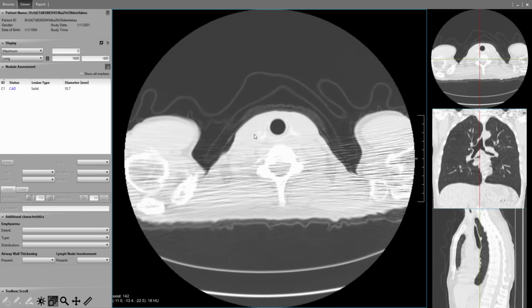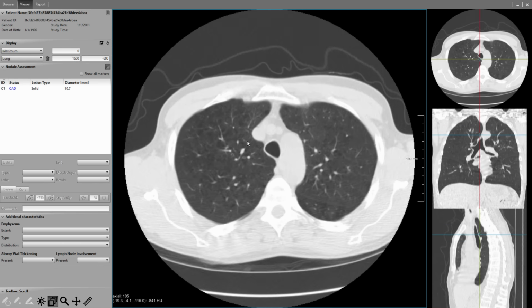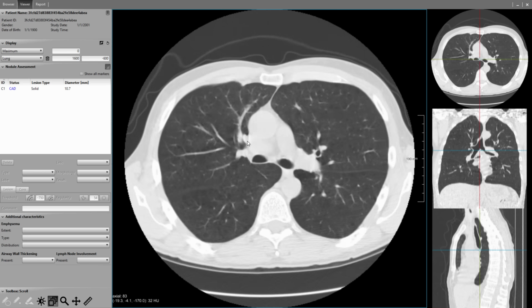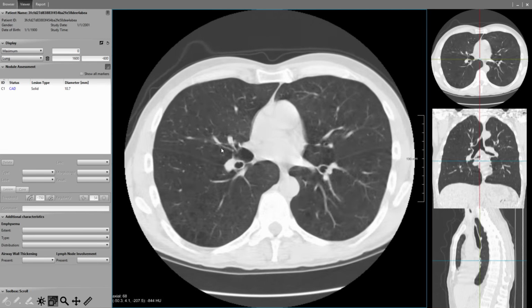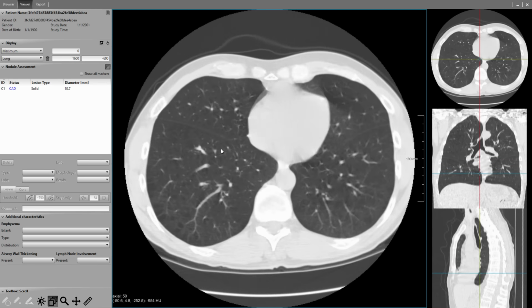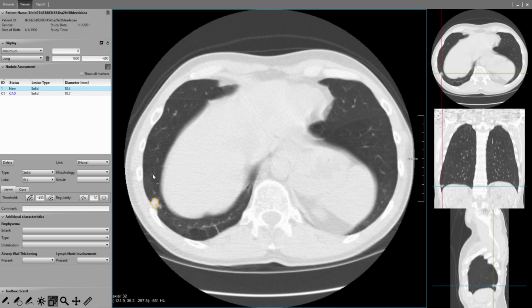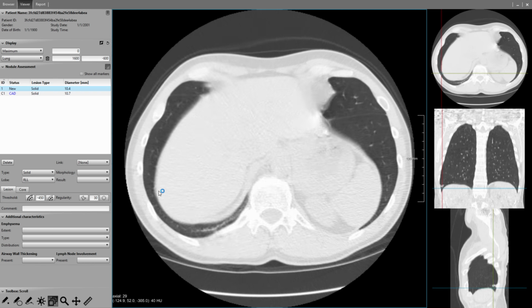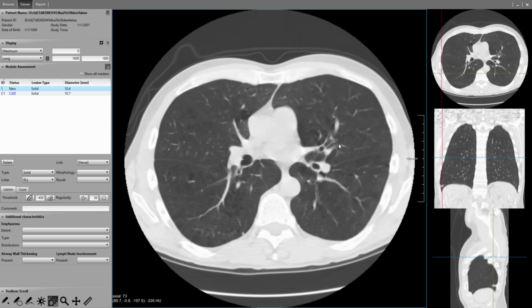This is another non-cancer case. Well, we see emphysema. Very small nodule there. Oh, and here's a big lesion in the lower lobe, but it's not a cancer case, so this must be a benign lesion.